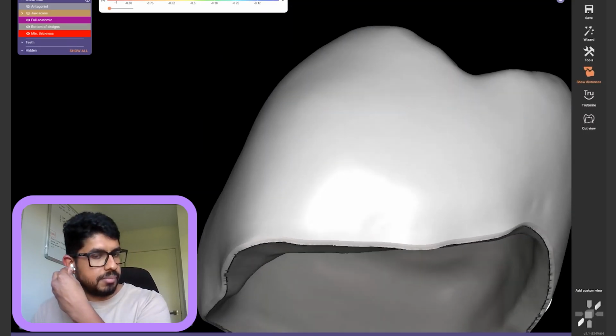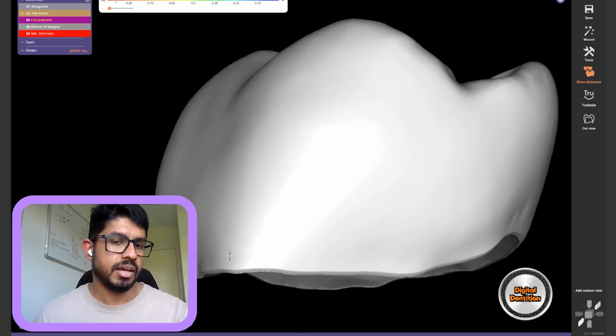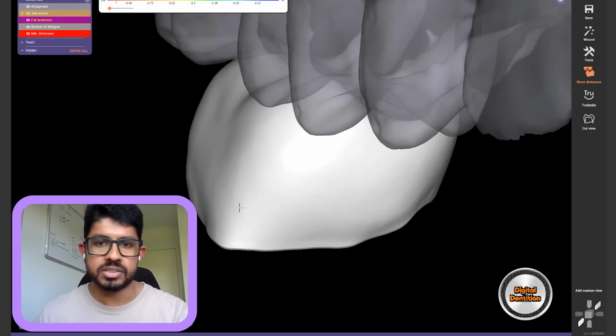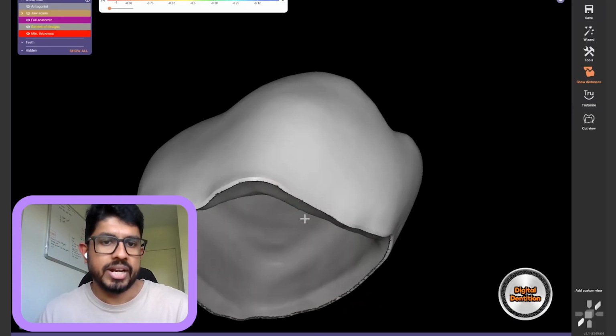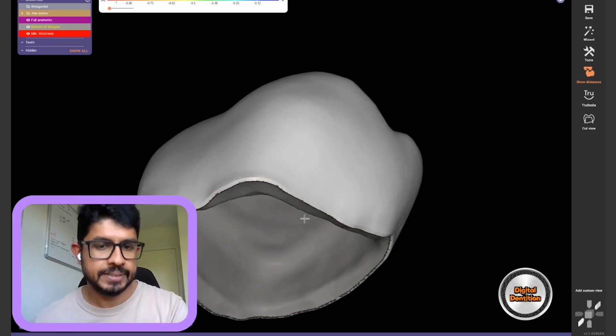It's not something you should be having when you're designing crowns. So that's probably the only thing that I would recommend in terms of adjusting. But as far as design goes, you've done a great job. Everything looks good. It's just a matter of knowing how to finish that margin much better, because when you try it in the mouth, you might end up wanting to adjust that overhang, and now it's like, oh, I got to glaze this again, and it's extra work.